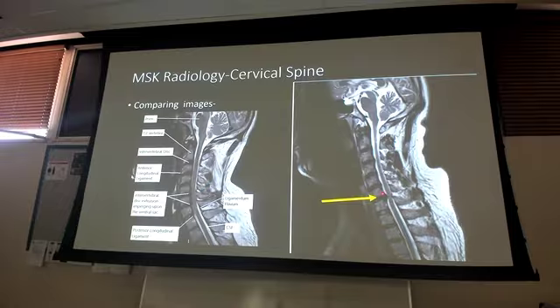It almost looks like I have this pinch here to where I can't see my cerebral spinal fluid sitting right there. Right? Because that disc is protruding posteriorly. Now, is it a herniation full on? Like, is the actual nucleus pulposus leaking through the annulus fibrosus? Or is it just a bulge? I don't know. I don't care because I have the disc herniation or disc bulge right there. You can use them interchangeably when talking about images because it doesn't really matter if it is fully herniated or just bulging because we're causing symptoms.